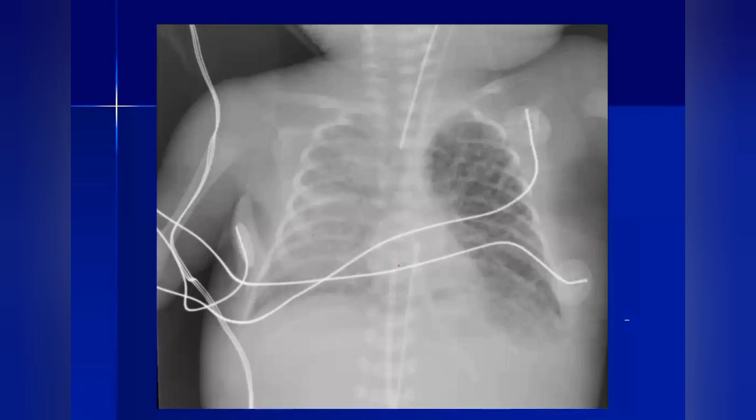Okay. Let's take it one by one, Dr. Sinha. I told you that when we compare this lung appearance with the multiple X-rays done previously, it's almost stable with hazy granular appearance of the right lung. And the left lung was almost similar to this one, and all of a sudden it develops this bubbly lucency, which is going from the center all the way to the periphery with some sort of hyperinflation. You see, it's slightly hyperinflated, the left lung. If you compare the left lung to the right, it's slightly hyperinflated.